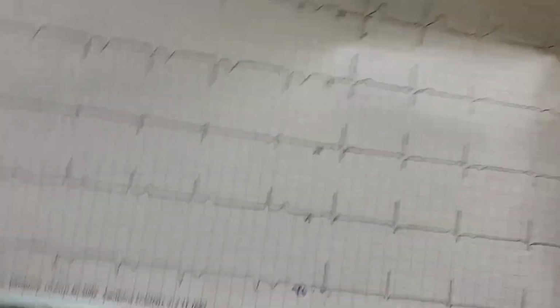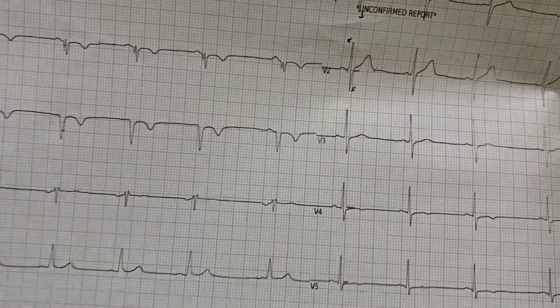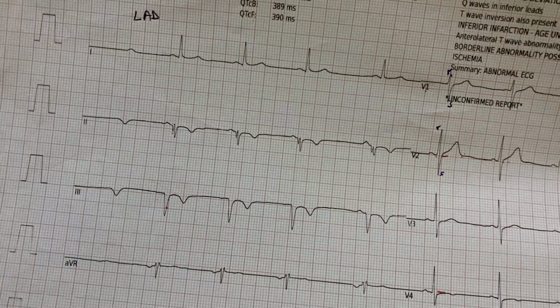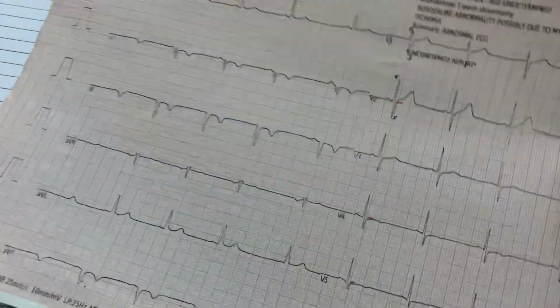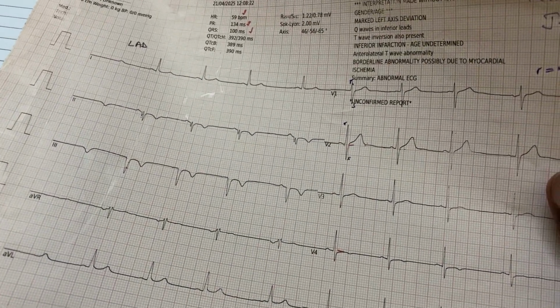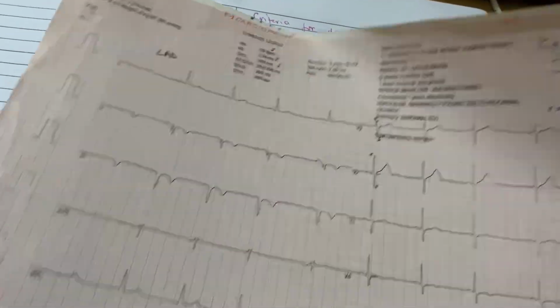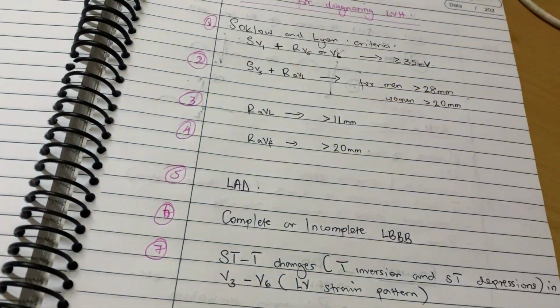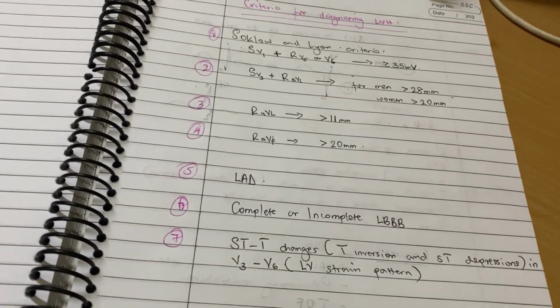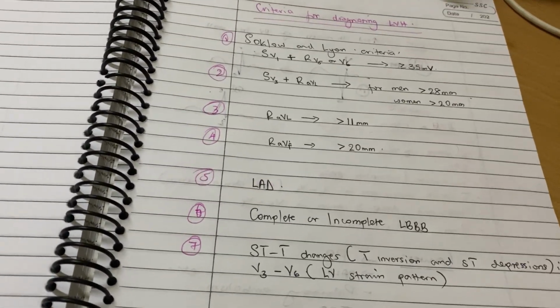But you may find this patient had LVH, but because the patient was obese, or had hypothyroidism, pericardial effusion or pleural effusion, all those can mask the effects of hypertrophies on the ECG. So now next part, we are seeing the real ECG and how to interpret them.